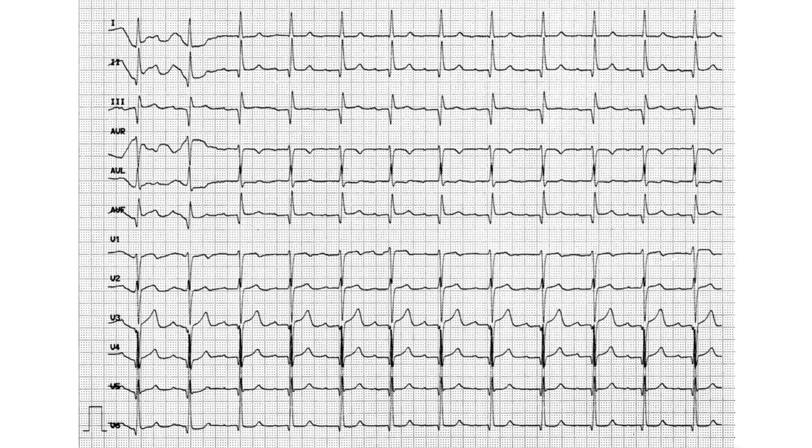Alright, if you need some time, you can go, but anyways. So you're going to start off saying, whoa, man, what is going on here? Is this patient alright? This guy's weird, man. So starting off, we want to check, is it regular or irregular? Okay, that's the first point. We actually ignore this part. Why would we ignore it? Because all of it is messy.